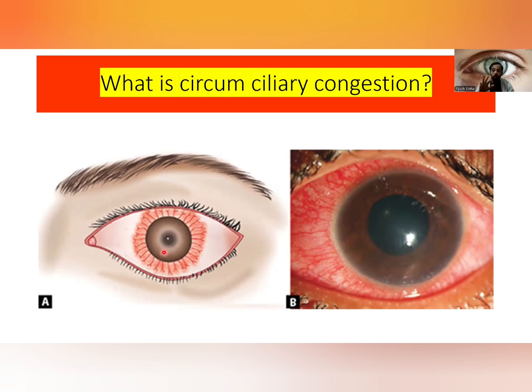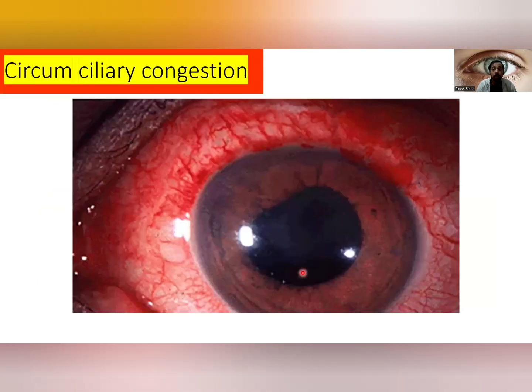The limbus is the area where the cornea and sclera meet, and the fornix is the area where the eyelid and conjunctiva meet. Here the fornix is quite loose so that it allows the eye to move properly. This redness appears in a more purplish manner rather than a bright red because deep blood vessels are getting affected. So let's move to the signs in multiple pictures, right?